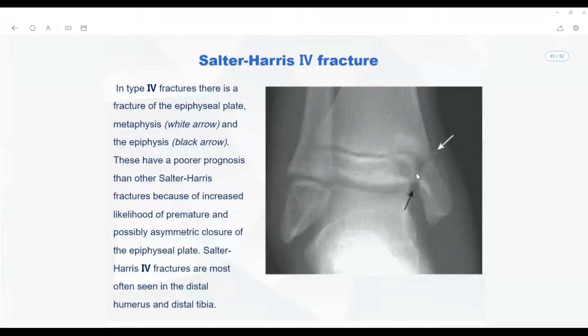If right now they are trying to close, you see here immediately after 11 days, what happens? Even all these fractured parts are going to get fused, right? So this will be permanently fused in this deformed angle itself, which will cause a permanent asymmetry and a permanent deformity of that joint as well.